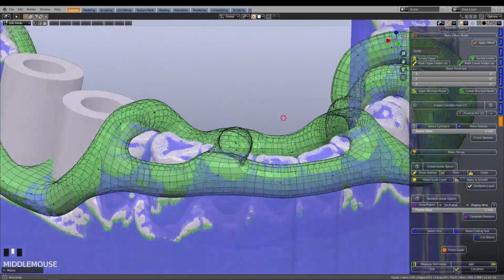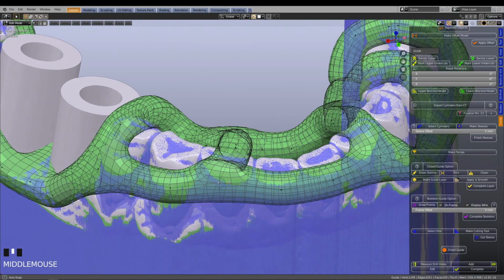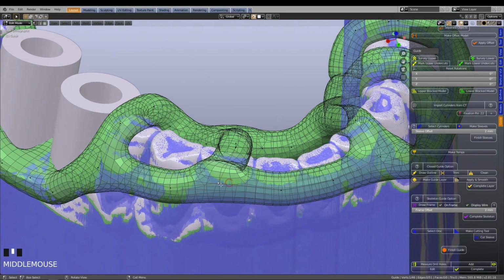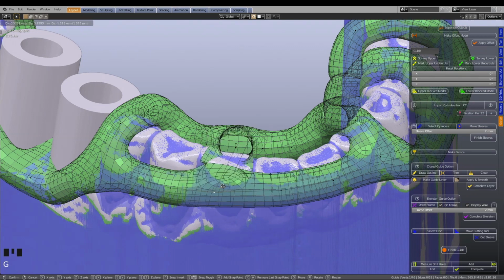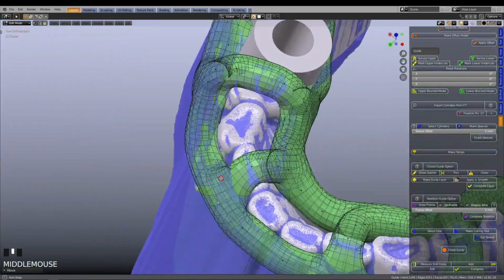In order to reconfigure the geometry of the mesh, click on one of the vertices in the area. Then use the G key to grab it. By moving the mouse, you can untangle the mesh from a tense-like structure into a more relaxed kind of state. You will see it unwinding, in real time. When the mesh has a more uniform structure, just left-click to set it down.